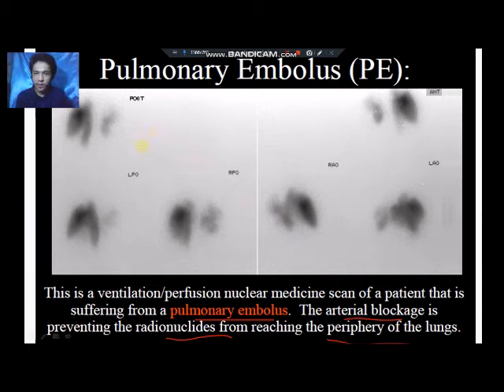Okay, so as you can observe na the other lung field is not demonstrated. Kana siya halos walay sulod. Okay, wala siya sulod nga radionuclide. Okay, so kung like for example in these lung fields, normal pa siya nga lung field. So that means that a lot of radionuclide kay nakaabot dira nga area. That means normal ang flow sa air or normal ang flow sa blood.